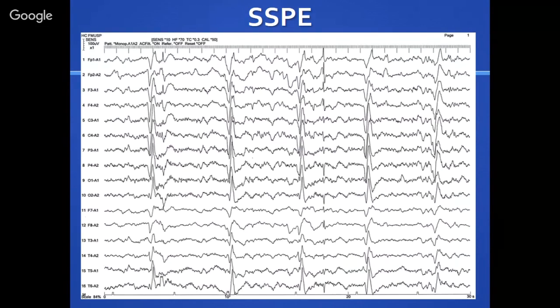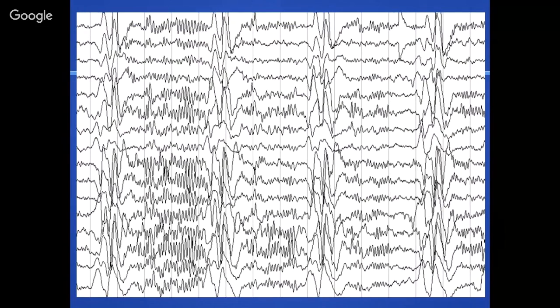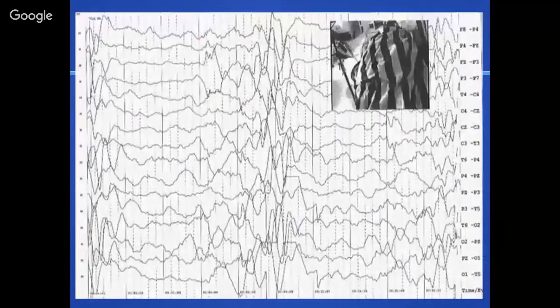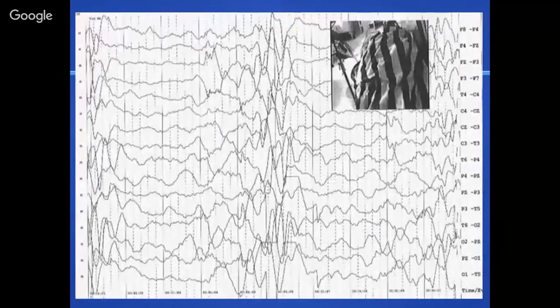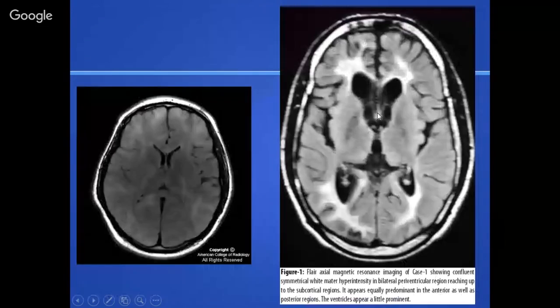What is SSPE? Okay, measles. And who can tell me what it stands for? Even this comes out in the test. And what's that? That's the same. This is almost like a burst suppression pattern here, with low diffuse slowing. It's also part of that.